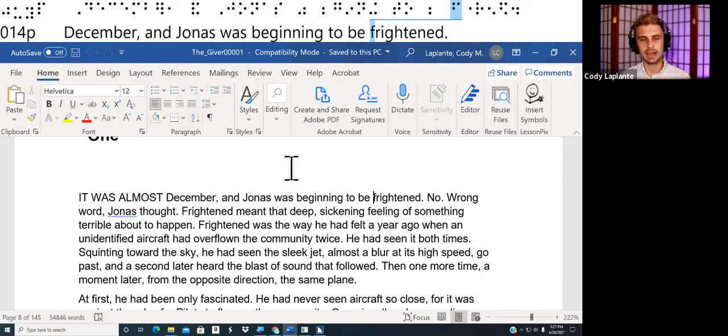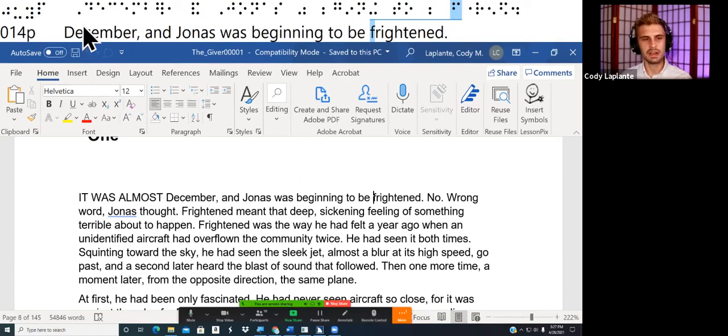The other thing that I know is, if you have enough vision, I have my Braille viewer open, okay? So we can see the Braille at the top of the screen. I see the regular English text up there and I see the Braille. That's a good indication it's in regular English, okay? So if I go back to my slide, let's see.